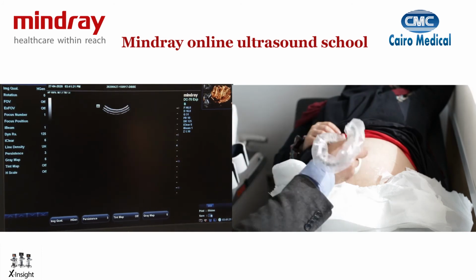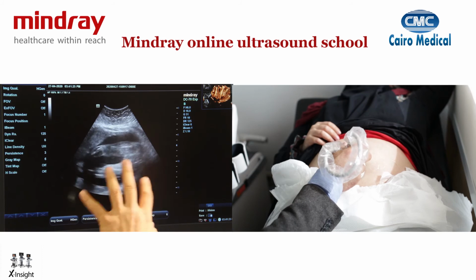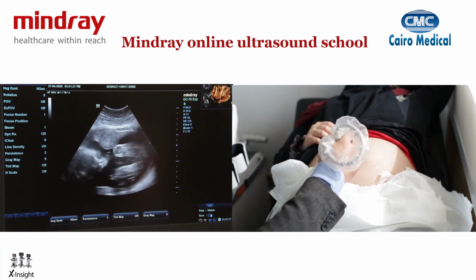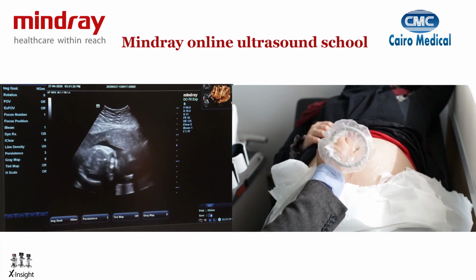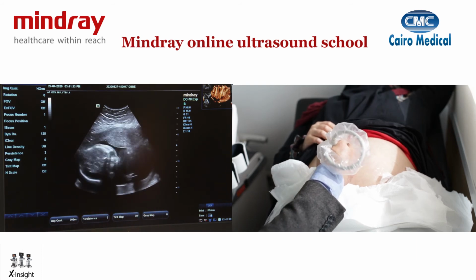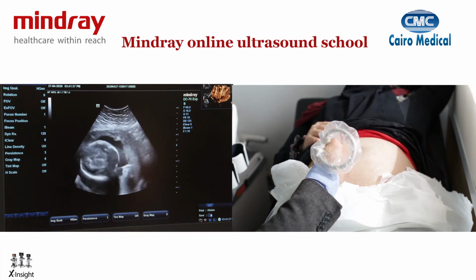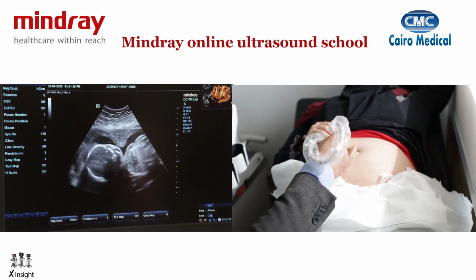So this was just a simple demonstration of how we can utilize the 3D on either surface structures or on multiplanar structures, or we can use different modes like inversion mode, maximum mode, or soft tissue mode, so I can see more of the bones or more of the soft tissue structures.